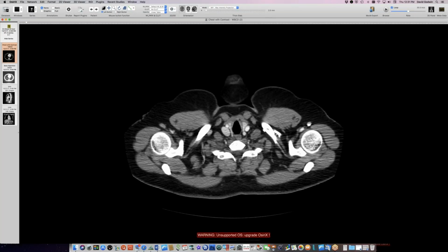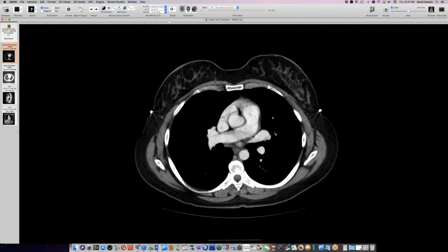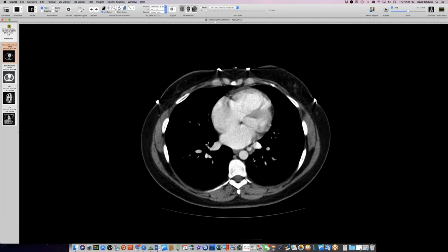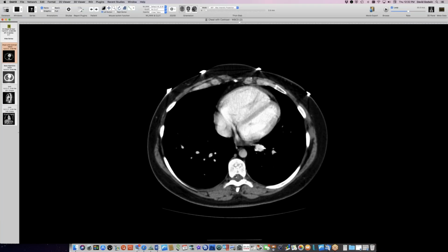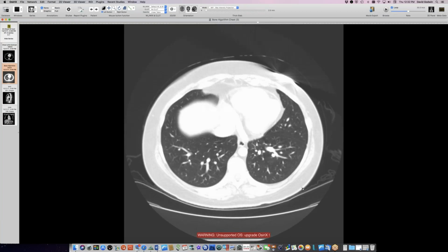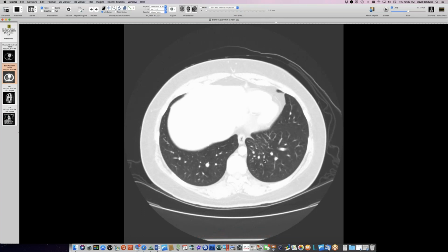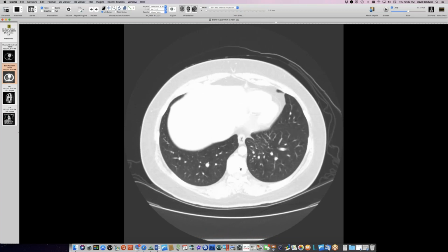But okay, I'm glad you're alert to vessels, because here's what the CT looked like on this person, and it caused some misdiagnosis here. So we do have a vessel leaving the descending aorta here and heading out into lung. Okay, and so we should look to see if there's anything that goes with sequestration, because that would be great. Instead, what we have is extra small vessels here in excess number. So it looks as if there are a bunch of extra little vessels here that weren't on the other side.